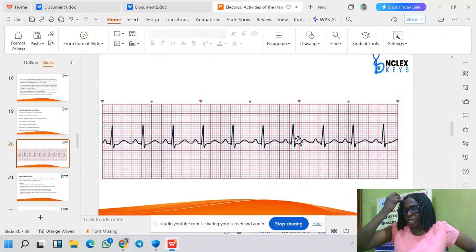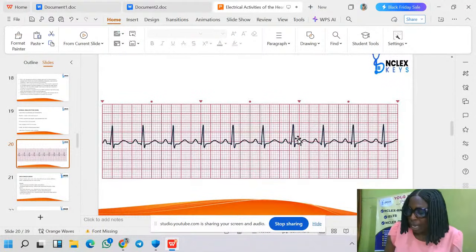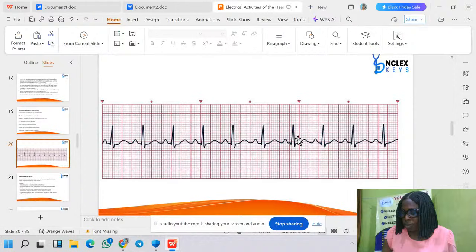Okay, I see someone saying 40. That's good. These boxes are 40. Thank you, ma. Now, can you count the pulse of this patient for me? What's the pulse of this patient?